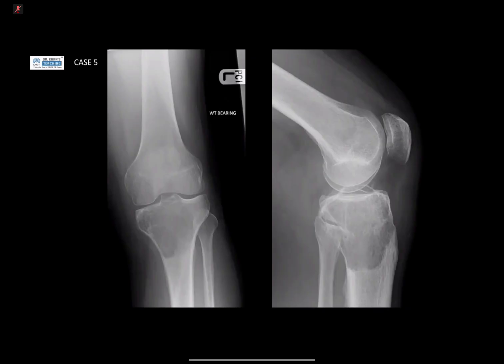I don't see any fracture of the surrounding cortices. I don't see any soft tissue mass. So this is a giant cell tumor for the patient. Okay, good. Can you talk to me a little bit? You said narrow zone of transition. Can you talk to me a little bit about the lateral margin of the lesion?